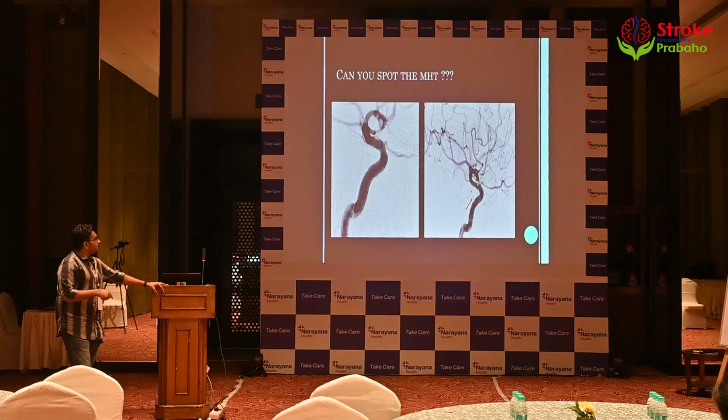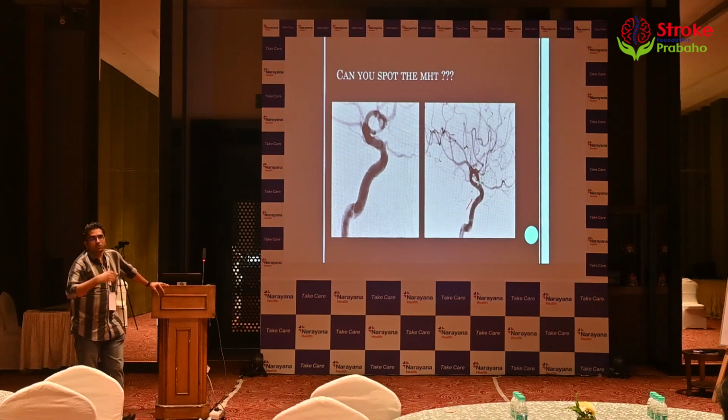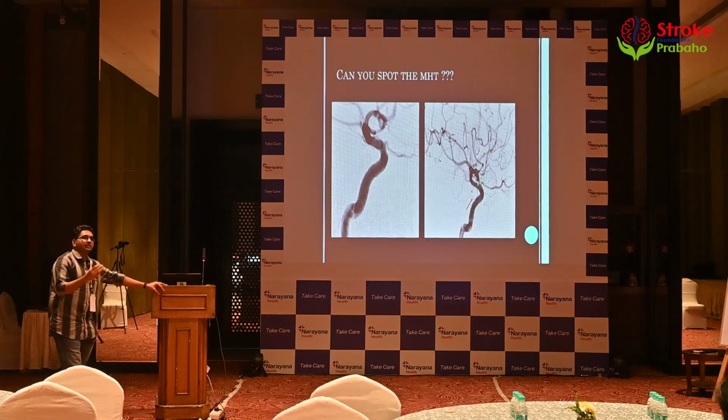But for DAVFs, if you're able to identify a small branch and then you see a blush, and then on your venogram it fills the superior petrosal vein, or if you're using an ASL showing the AV shunt, these are beautiful ways of increasing your probability of an occult DAVF in a patient presenting with tinnitus, in a patient presenting with giddiness. Because this contributes a bulk of your patient spectrum.